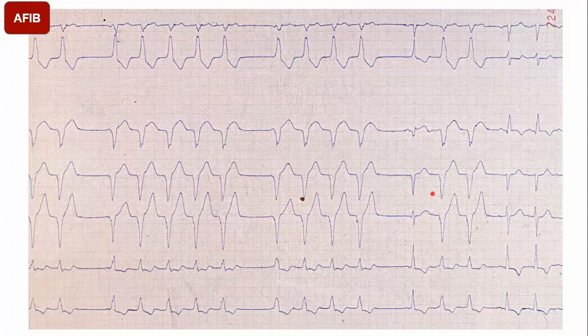Now this does not look like a standard EKG. Because the leads aren't really numbered, they probably have different leads going, but we just don't see the numbering here. But I wonder if this is a patient with a bundle branch block, because we see these big QRS complexes. It doesn't mean that this is all a ventricular rhythm. This is likely atrial fibrillation with a bundle branch block attached to it.